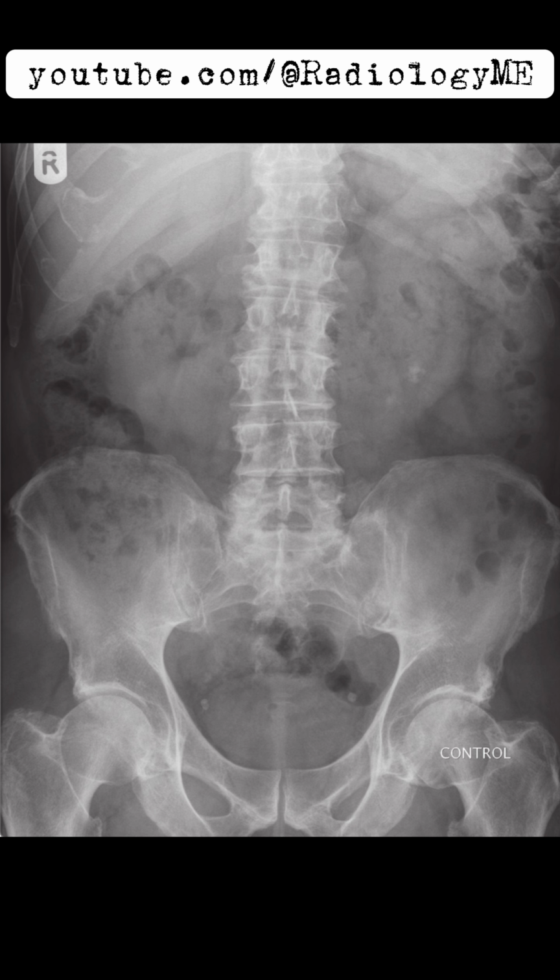Wrapping it up, I'd report this case as a patient with a horseshoe kidney and evidence of calculi in the left lower pole, and I'd recommend further evaluation with contrast-enhanced imaging to assess for any obstruction. That's how I would present this case, walking through the findings, forming a differential diagnosis, and wrapping up with management.